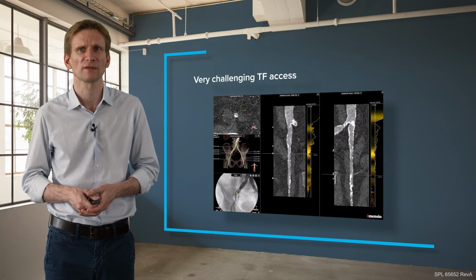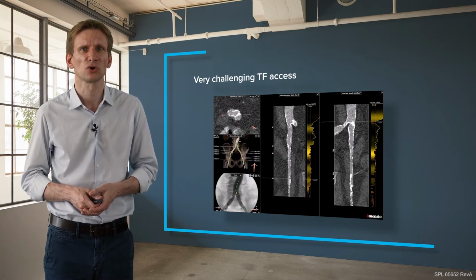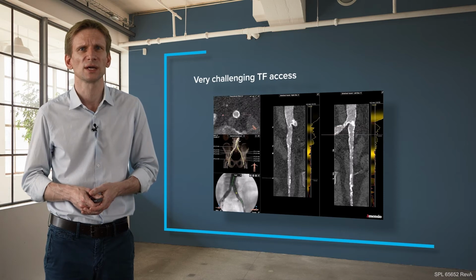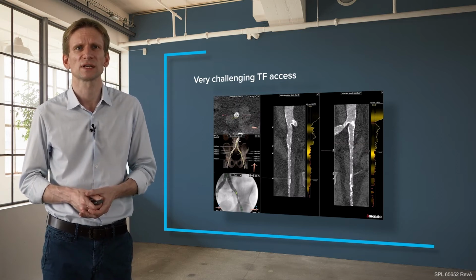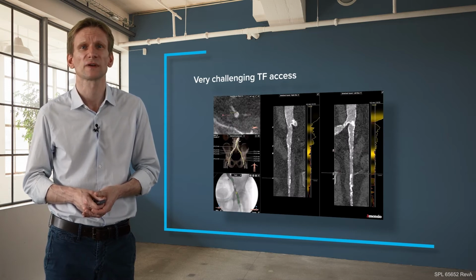But of course, you also have the left-hand side. So now on this analysis, we also look on the left. There's also a lot of calcification, but okay, this is in a way ideal for IVL treatment. So this is 360-degree calcification. This maybe less so. Here we have a 360-degree calcification, but still it's within our boundaries as we accept for transfemoral TAVI for IVL treatment. Here, a big chunk of calcification.